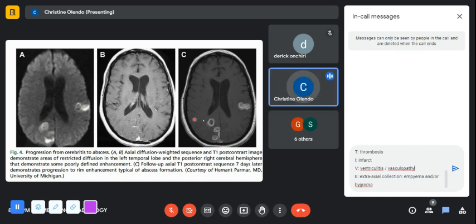That is the C. And B is also a T1 with contrast. When was that done? Now I think A and B were around the same time. Yes, A and B were the same time. And it was showing how DWI shows the disease earlier, there's more information, than a T1, even a T1 with contrast, because the B looks actually normal.